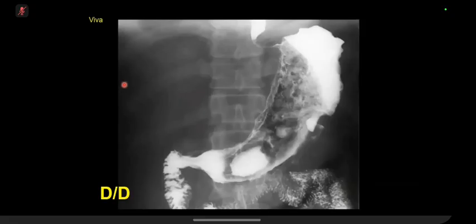So I'm presented with a spot fluoroscopic image from an upper GI barium study. There is gross abnormality of the stomach, specifically the body and pyloric antral regions, with multiple areas in which there are pooling of barium with surrounding less dense halo suggestive of cratering or mucosal edema. I can see 3 such areas along the greater curvature.